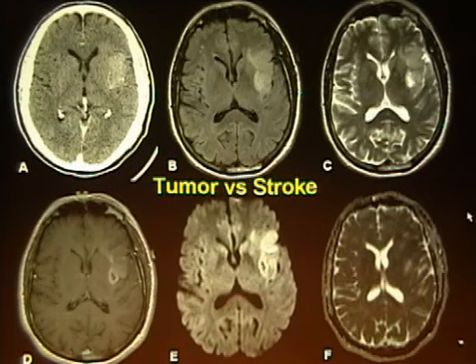Who thinks this is a stroke? Put your hand up. Everyone has to put their hand up once. Who thinks this could be a tumor? Put your hand up. Okay, so again in the audience, 50-50. Very good. So this was read as a left insular infarct with perfusion and spectroscopy and was sent to us for further workup and for surgery.